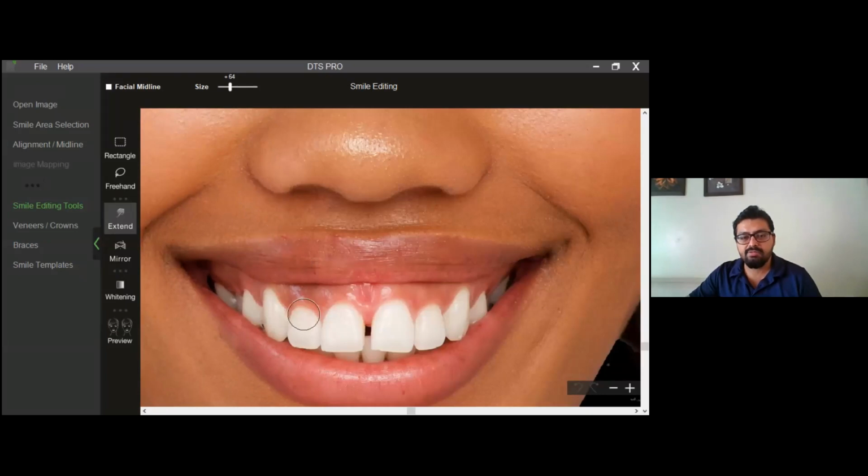So we have these tools where we can easily simulate crown lengthening. For example, what I'm doing here is shifting the gingiva up in a cervical direction. Many a times only a little bit of crown reshaping. Now, of course, the discussion primarily would be orthodontics, but since this is a software which involves visualizations, there would be a little overlap of other specialties as well. But yeah, a little bit of crown lengthening is what I have done here.